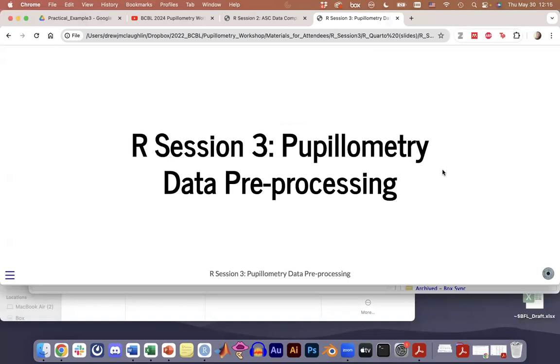One thing that I typically do when I'm reading in files and setting directories is make relative directories, where you can just say jump into this folder, and put a dot or two dots to indicate the current directory. No, this is good advice to repeat for anyone online.